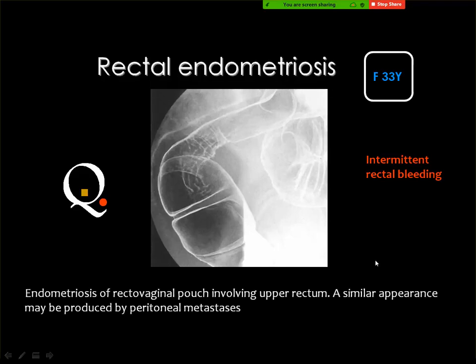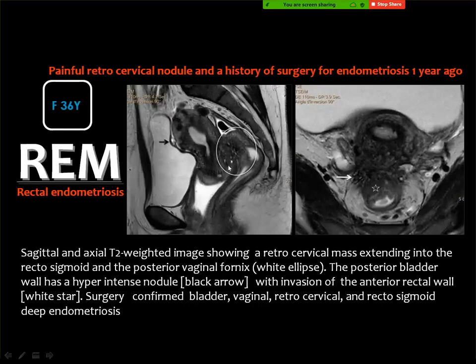Endometrioma. Endometriosis. This is a very classic appearance for endometriosis in the rectum. And you got irregularity, which is seen also in the MRI as mushroom shape. And this is an example. Here you see this is the endometriosis. It usually affects the anterior aspect of the rectum, while in the bladder it affects the posterior aspect of the bladder. And you got these very characteristic bright signals within the lesion, and also the classic history of periodic bleeding.